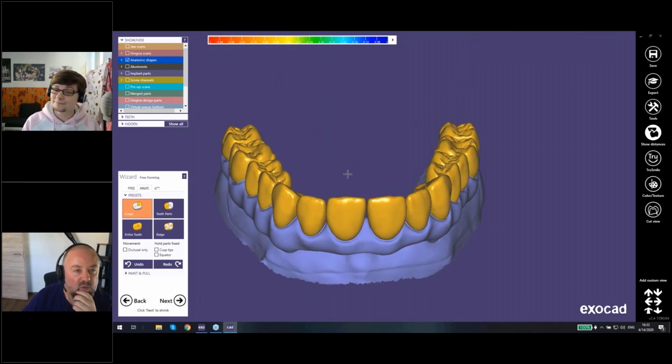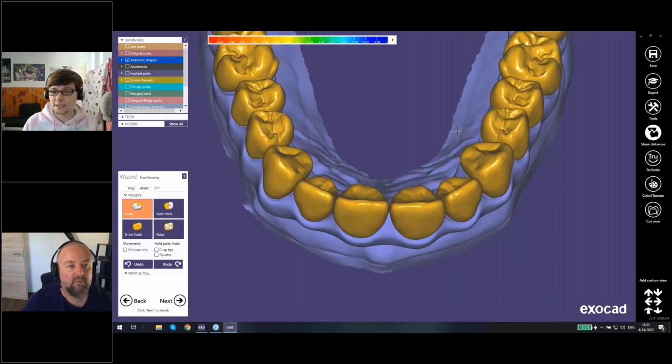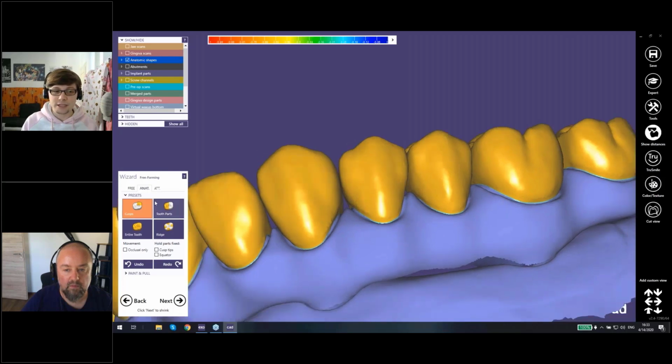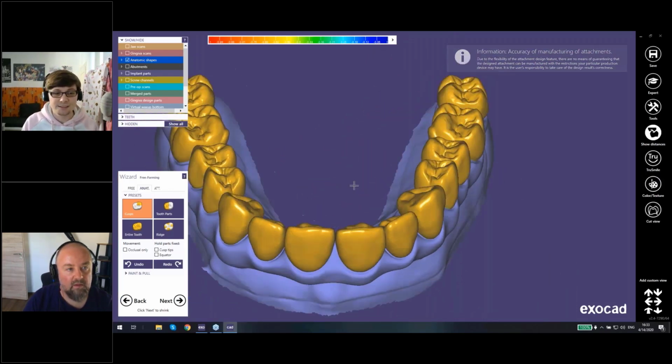Friedemann, there's one question coming up for the third time now. That's why I told these guys that we maybe show that at the end. So the question is, is it possible to create the same hole in the secondary crown? Maybe you'd like to show that at the end with the attachment feature. Yeah, I will show it at the end when they're merged, because if you want to design a hole in a crown for a screw channel, you can use this attachment feature here, but you can only really use it once the complete crown is merged. So I will show it then and explain again in detail.